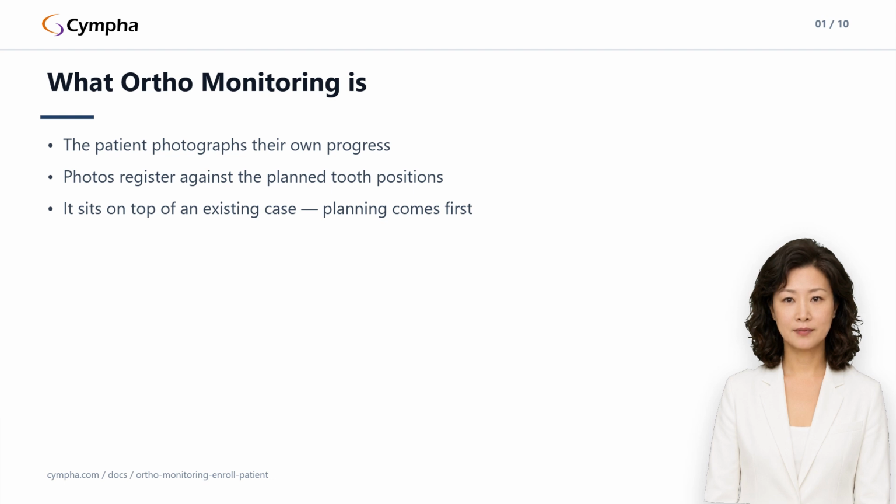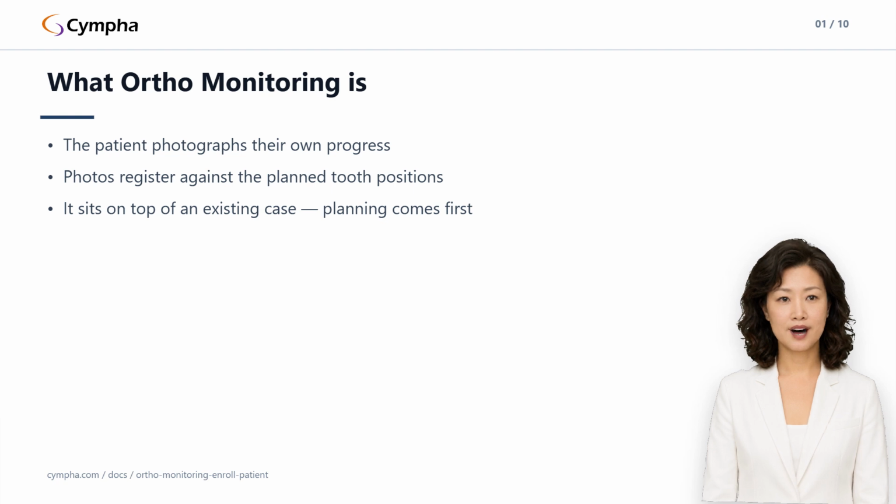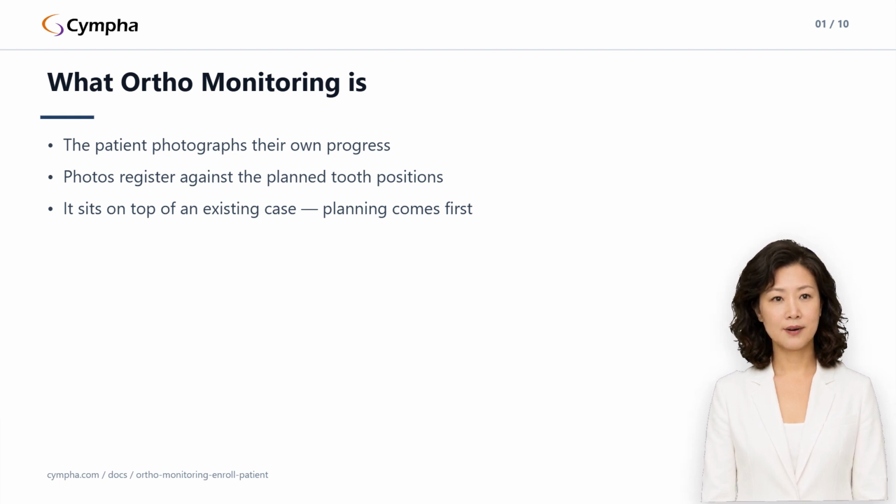It doesn't replace planning. Ortho monitoring sits on top of an existing case with a finished plan. If you don't have a case ready yet, create one from an existing scan, or import a plan from Ortho Plus or Studio first, then come back here.